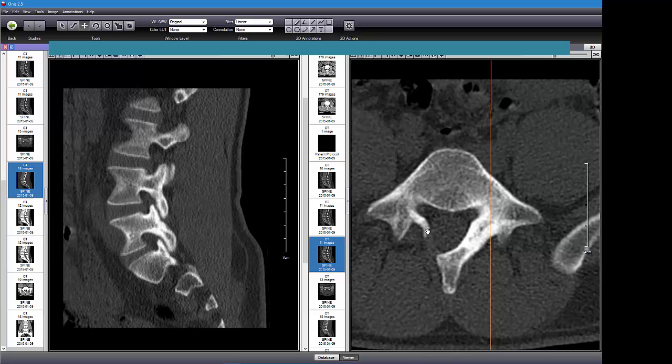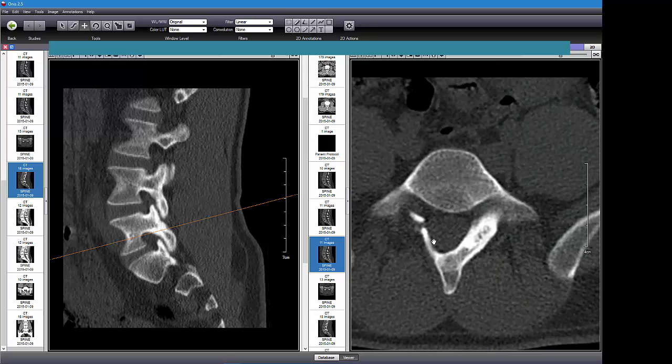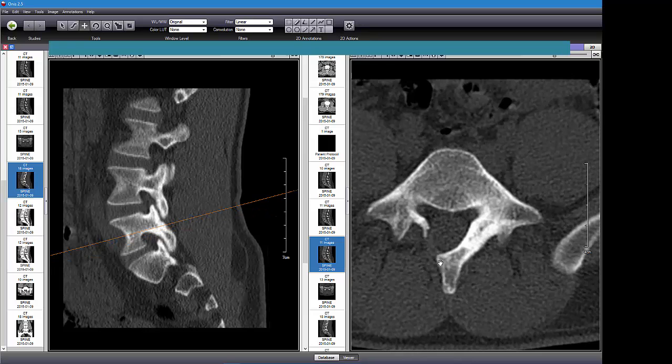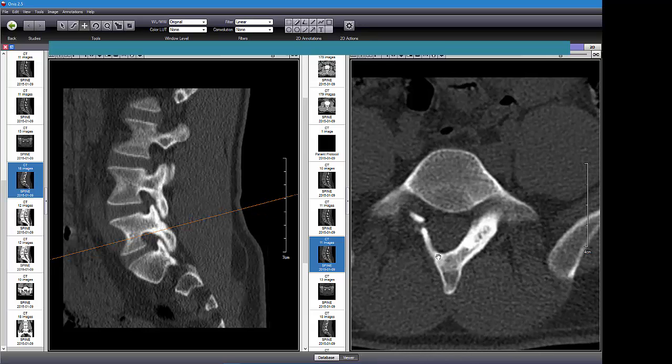But you can already see a huge problem here. And so this is deformed. This is a one cut. So this is not a perfectly flat cut like this. This thing is dipping down. It's not absent. It's just we don't see it. Watch if I go down a cut. See how it pops up? It's just anomalous. It's grown not as a straight piece of bone. It's all crooked. But you can clearly see between these there's definitely a fracture here.